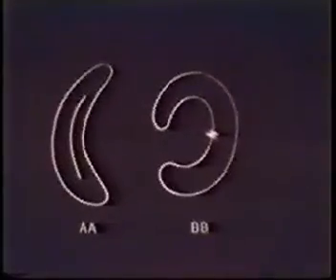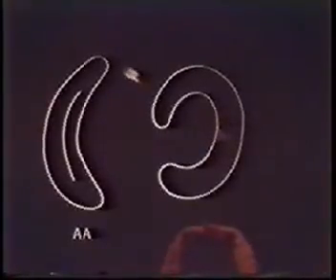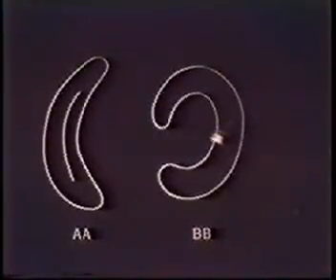I have a slide for this, but I didn't put it in. You get a little bit of an oblique tear right on the free edge here, and it starts on the free edge there, and it kind of goes into the meniscus like this. This little lip, this little attached fragment, so to speak, will then kind of fly in the breeze out here, and when you look at it at surgery or at pathology, it looks like the beak of a parrot coming down there. And that's why it's called a parrot beak tear. So it's just a little tiny tear here with a little lip or projection of the meniscus as it's partially detached here, which looks like a parrot beak sticking out from the meniscus. That's why it's called that.